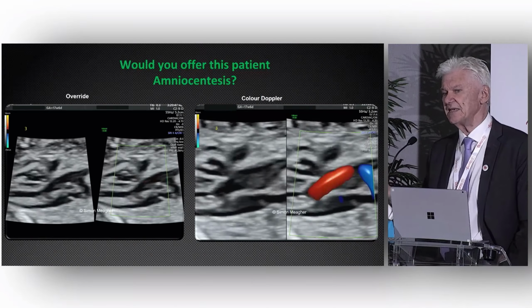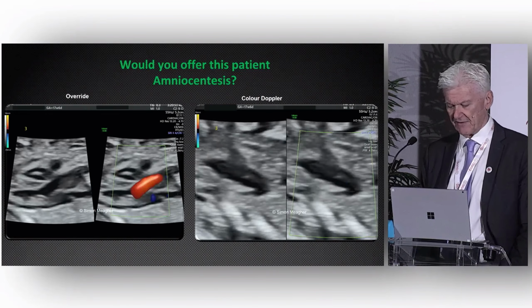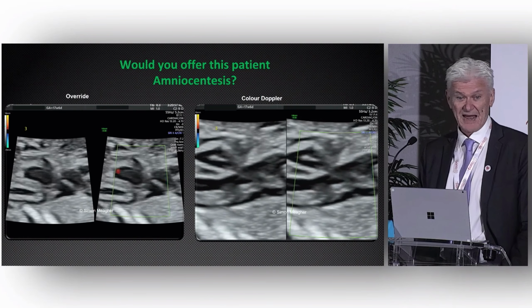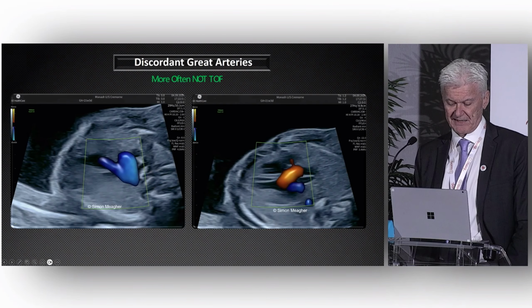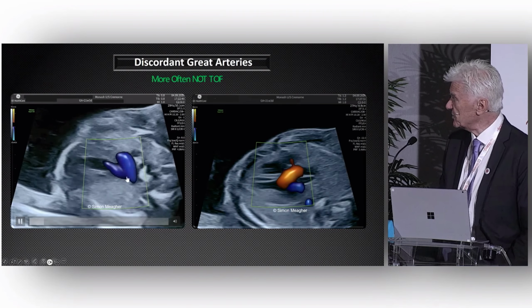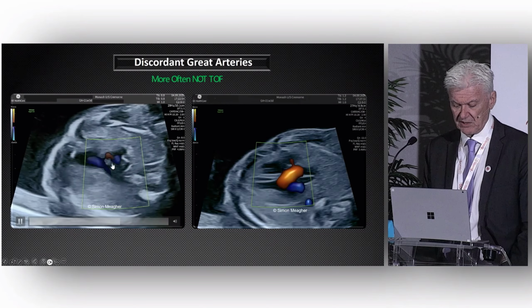It is very easy to create an impression of the aorta looking astride when you go in an oblique 4-chamber or an oblique left ventricular outflow tract. This baby is completely normal. And I have to admit that I have, in my training and in my years of practice, made a call of Fallot's in a baby that was completely normal after birth. I've learned my lessons. And I can also share with you on the 3-vessel tracheal view, this is much more common. You're nervous because the pulmonary artery is smaller than the aorta.